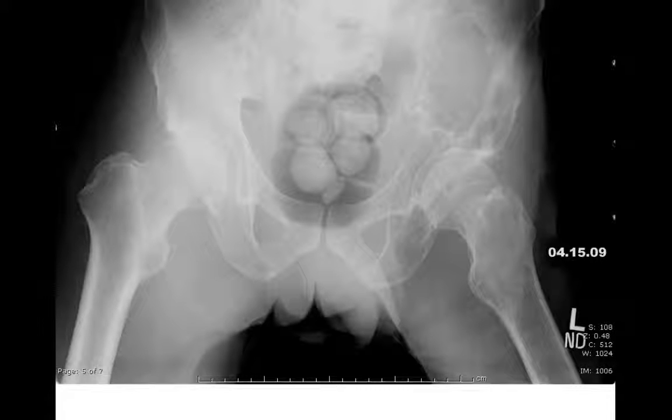All right, so this is our first case. We have a frontal radiograph of the pelvis. We have multiple areas of lytic lesions throughout the left hemipelvis and the left proximal femur. I would say this is not a geographic lesion because it's so extensive in this case, so I would call this a moth-eaten or permeative lesion. In this case, it's pretty big holes right here, so more moth-eaten in the hemipelvis, and if you want to talk about the region of the femur, you could call this more permeative. But overall, diffusely infiltrating moth-eaten lesion, multiple lytic lesions throughout the left hemipelvis and the proximal femur.